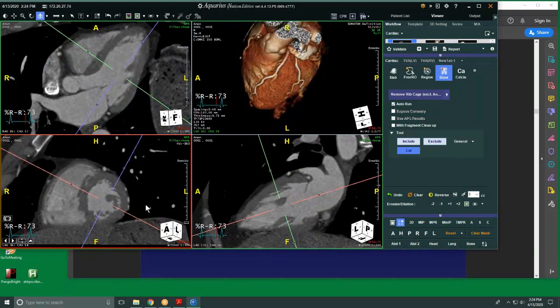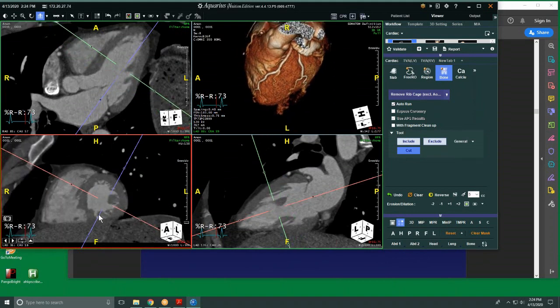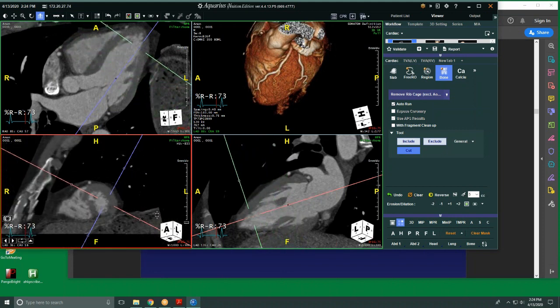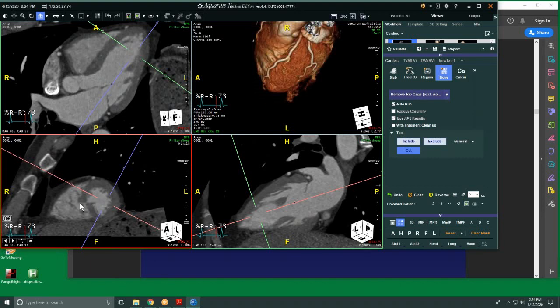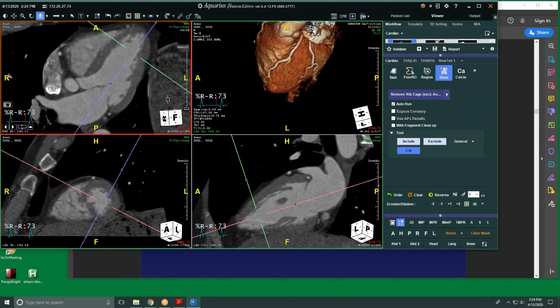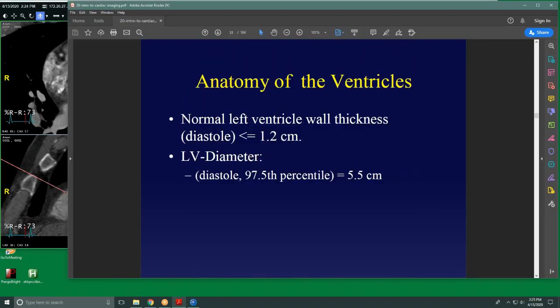They're normal structures, and I've seen them referred to as papillary muscle bundles, because there are a lot of little muscle fascicles here. So sometimes people call it a papillary muscle, sometimes a papillary muscle bundle, but there are 2 of them, for the 2 halves of the mitral valve. And you have a little bit of cardiac pulsation artifact. See that there? You really don't have a discontinuous left ventricle here. That's due to some artifact. You see right over there, that's just some artifact from pulsation.